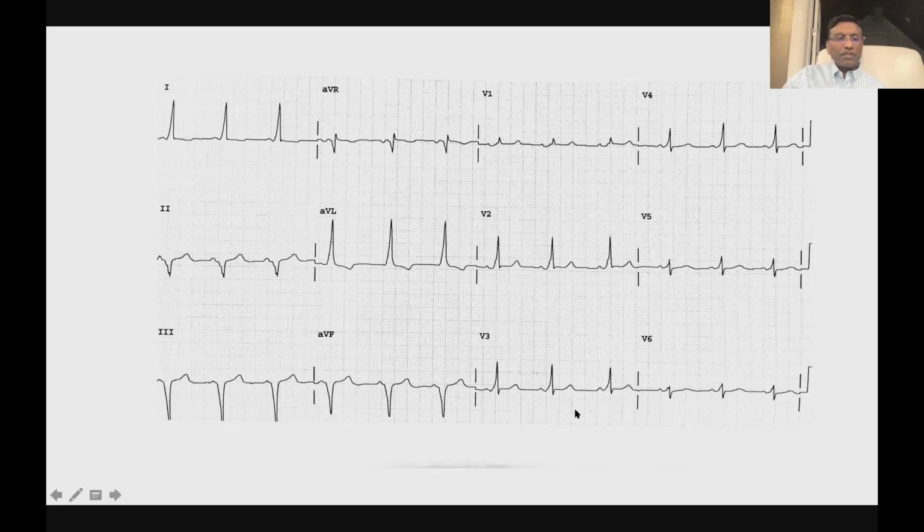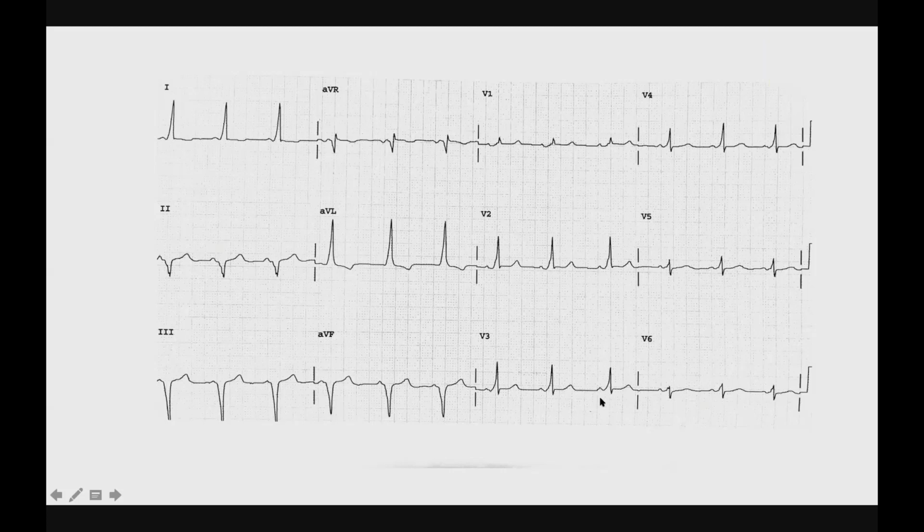It does look like these are Q waves here, but are they really infarction Q waves? Look at this complex here. Focus on V3. Now, what do you think? Any thoughts, any change of heart? Look at the P wave there and look at the QRS, and what do you make of that? There's a delta wave. Very good. So you have an almost non-existent PR interval. It's just a very quick onset of the delta wave leading on into the QRS.